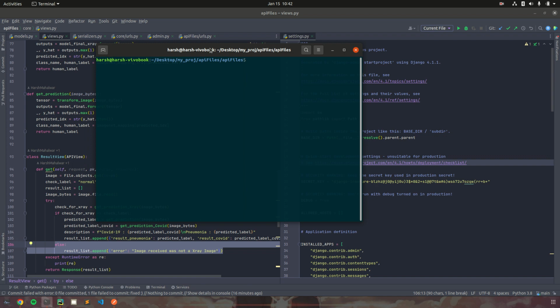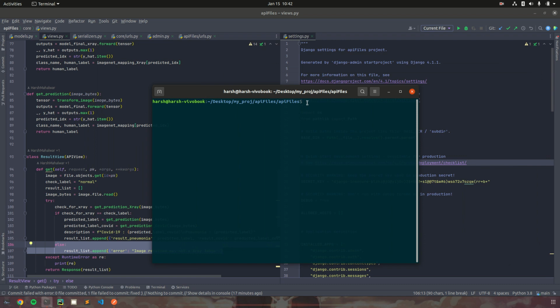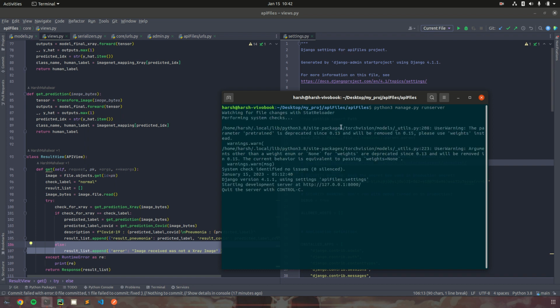Okay, so in this video I'm going to explain how to use this XrayNET API. Basically, what you have to do is, first of all, simply start the server, and even before that you will obviously have to set up the requirements.py file. That's quite important.